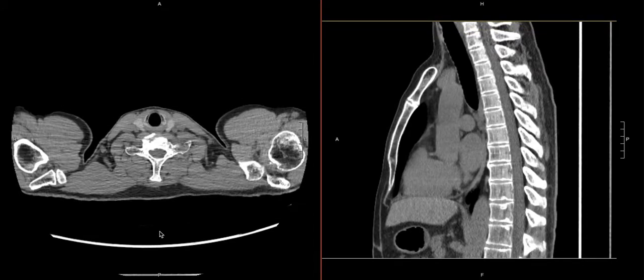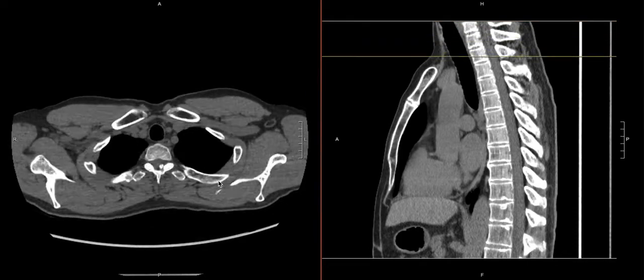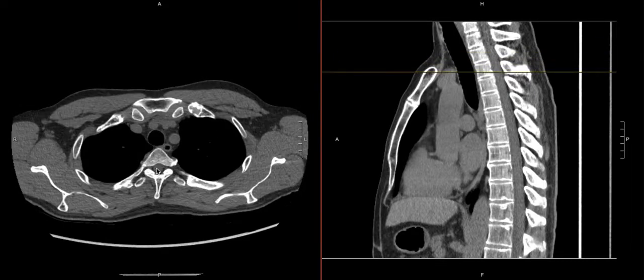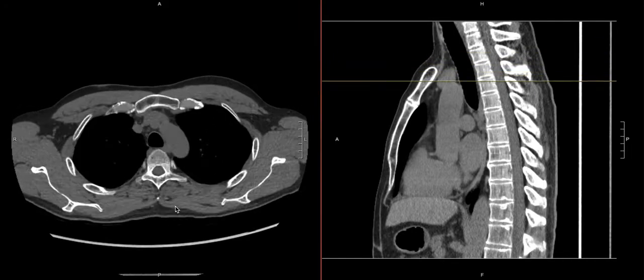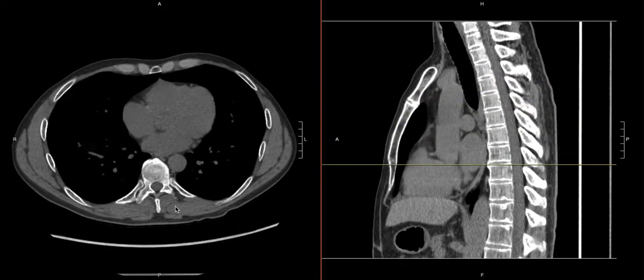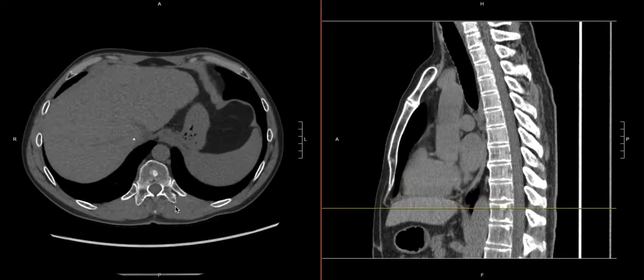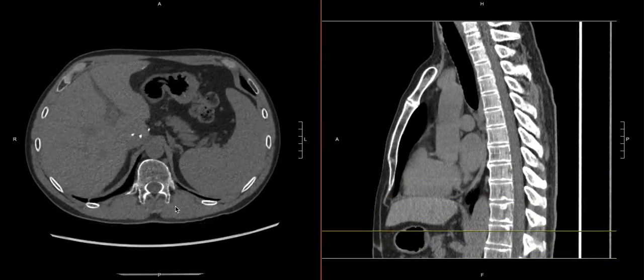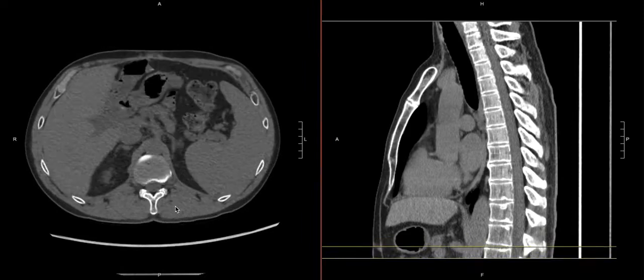At the end, depending on your context, what you can do is switch your window a little bit so you can actually look at the spinal canal and see if there's any soft tissue abnormalities in the spinal canal. You can look right here, see if there's any herniating discs, anything that's causing significant osseous narrowing or causing impingement upon the spinal canal.